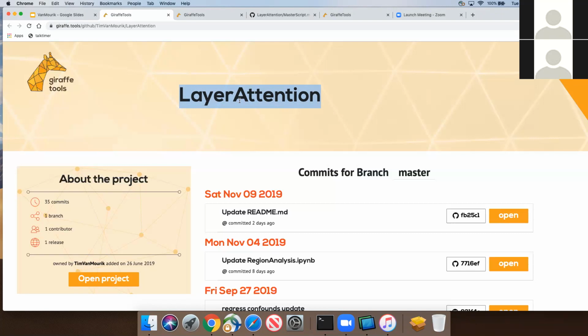In a GitHub directory, who's using GitHub actively? And the rest knows of GitHub? Yeah, a bit. It's a version control website with your code. So, right, you seem familiar with that. It loads all the commits from there, and it loads the analysis files from there as well.